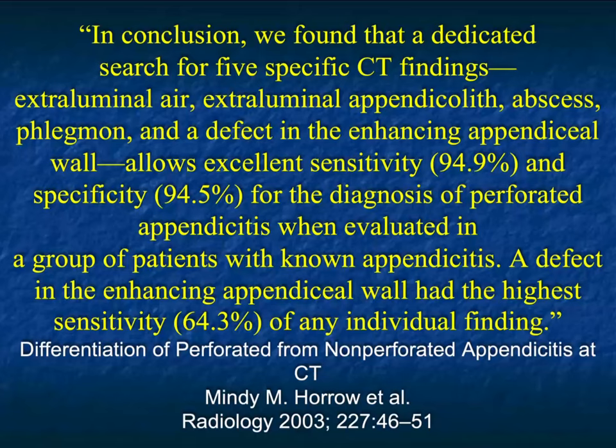So again, I don't think it's that difficult. The main thing is making the diagnosis of appendicitis. When you see a significant amount of fluid or air present, you're going to read appendiceal abscess with perforation, and surgery is going to be done.